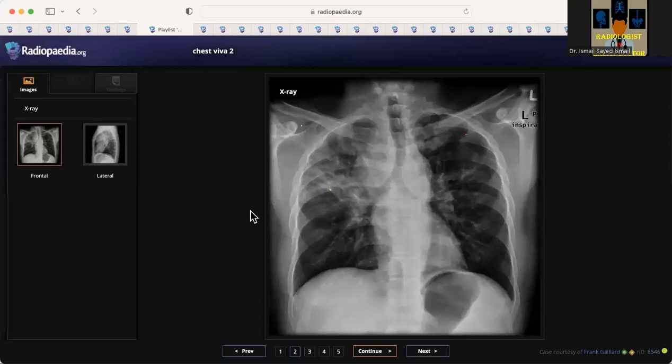And I'm not sure if there is an overlapping infection, so for which I would talk to the clinician if the patient is having any fever or any raised inflammatory markers, because the consolidation could be due to an infection as well. So yes, I will think of stage 2 pulmonary sarcoidosis as a possibility, and I would advise a CT if it's a fresh case.